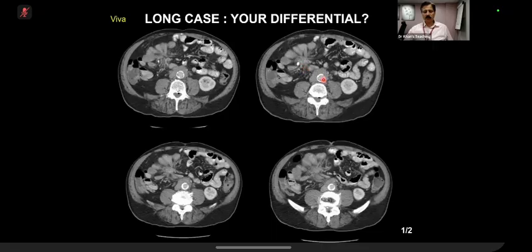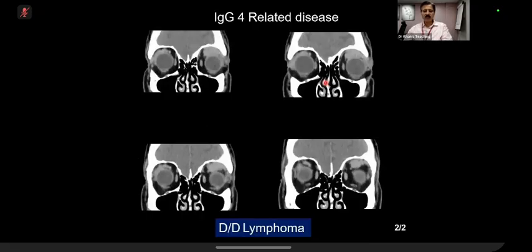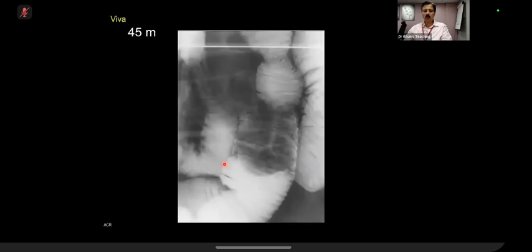So one can infer that this might be treated lymphoma. So 2 + 2 makes 4. And the same case can be given with findings in the orbit, which we'll cover in the head and neck. But having said that, this is again the same differential, lymphoma versus IgG4 related disease. Take home point is that orbital pseudotumor, the old terminology, is now no more used.